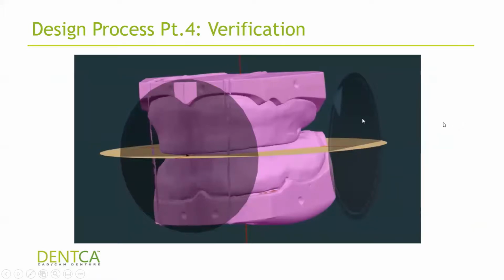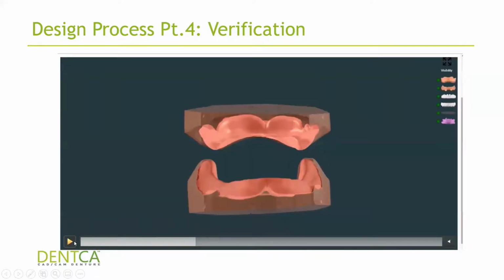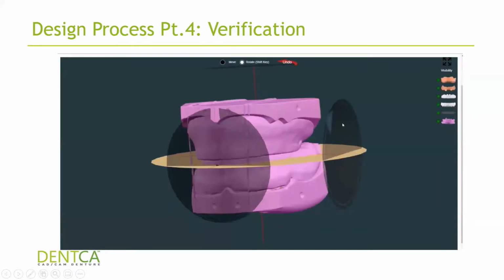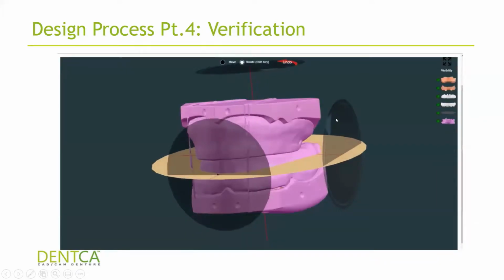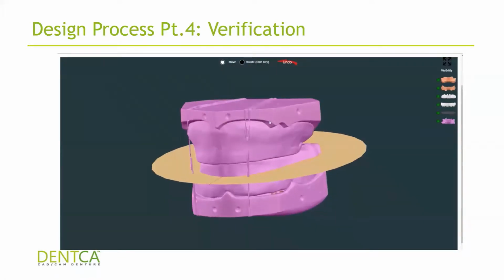And then you're going to get a third part where you can actually adjust your occlusal plane. The software calculates it ideally based off of your landmarks and your vertical dimension. And if you entered an upper lip length, then it's going to use that as information as well. But you can modify it in here. You can tilt it to every angulation. So basically on the video, it's going to show you the different areas, and then you can adjust the occlusal plane as you're moving. Just so you know, that red line in the middle is your midline.